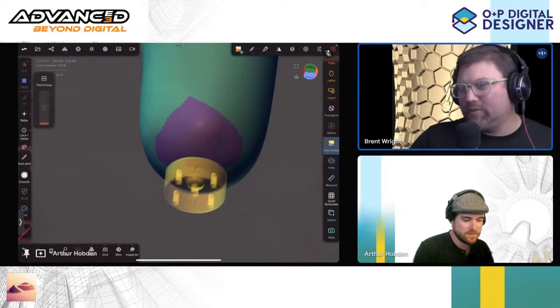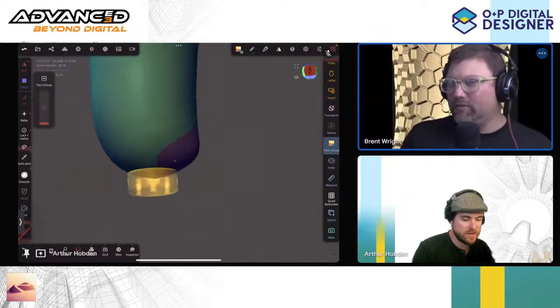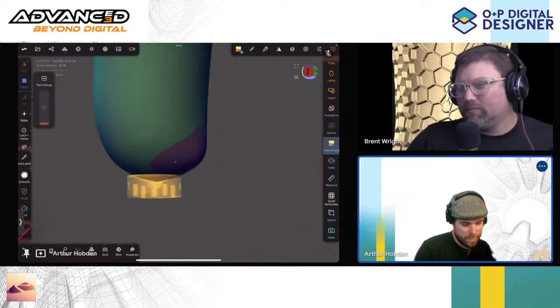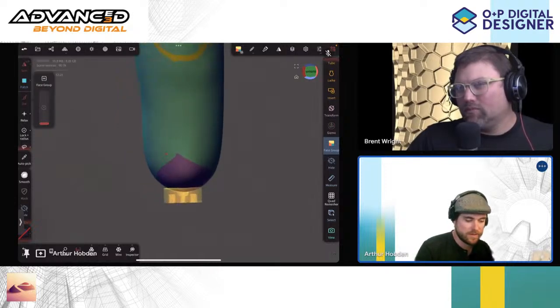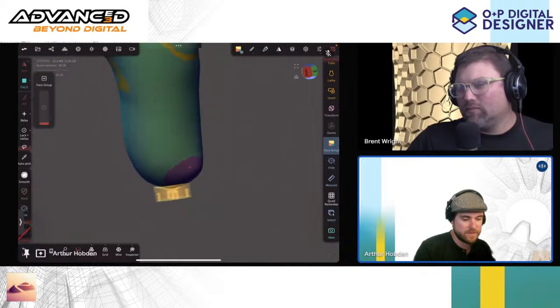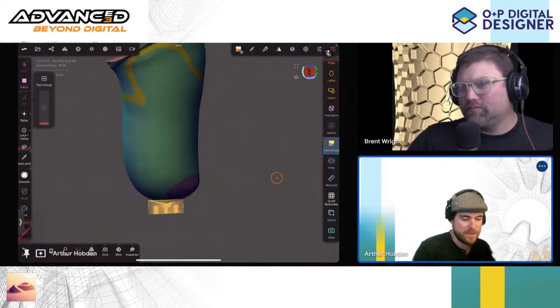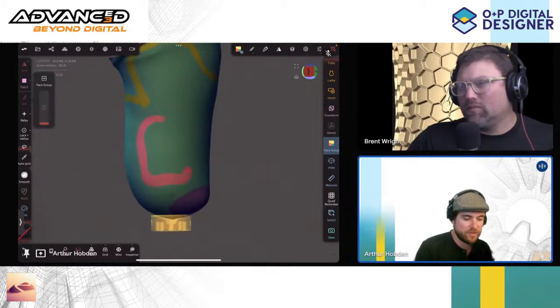And then that buildup doesn't necessarily go just out. It actually goes out and down. Out and down. Yeah, so almost like a flattening. Maybe I might try and use the scaling tool. All right, so something like that for that first one. And then the medial lateral group, would that be a band with a one-dimensional scale, or would we actually just draw out a section we would flatten and bring in a bit?